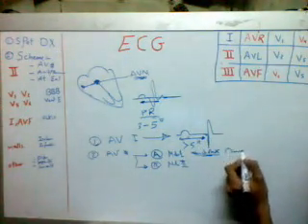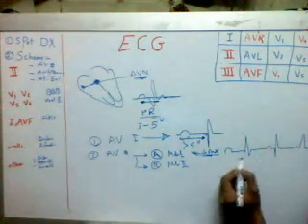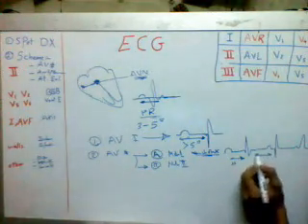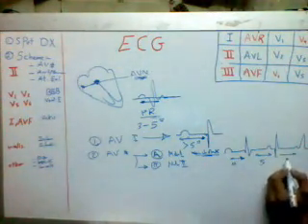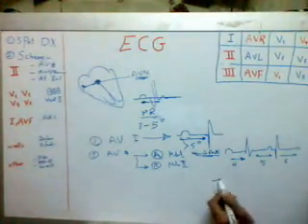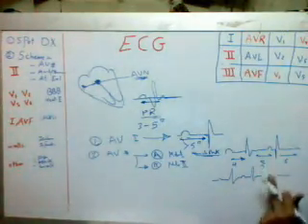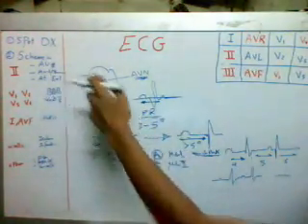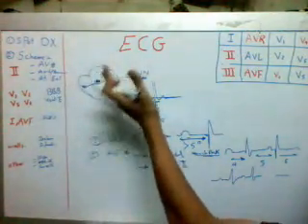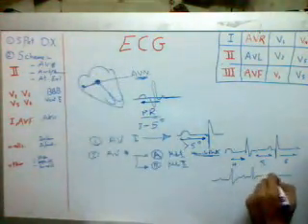You see P wave, QRS complex, P wave, QRS complex. Suppose the PR interval here is 4, then 5, then 6, then 7, then a drop. When you see this, there is a dropped beat. The conduction in the AV node is slow, increasing with ischemia, and suddenly there is a drop in the conduction.